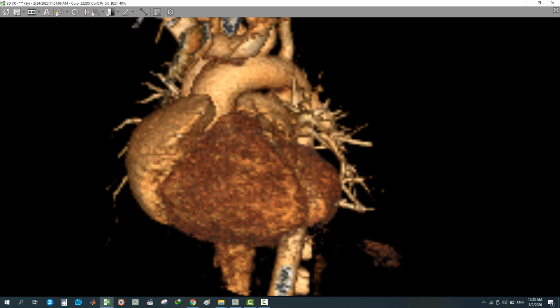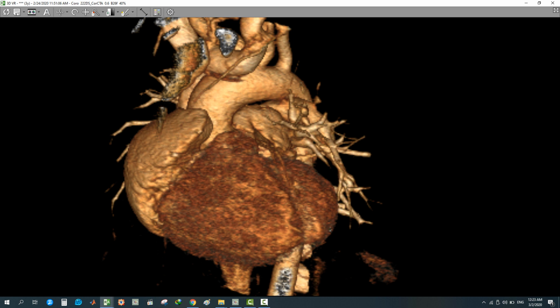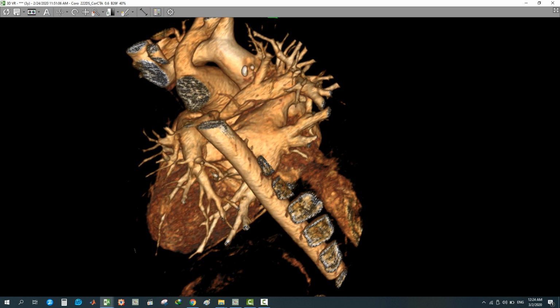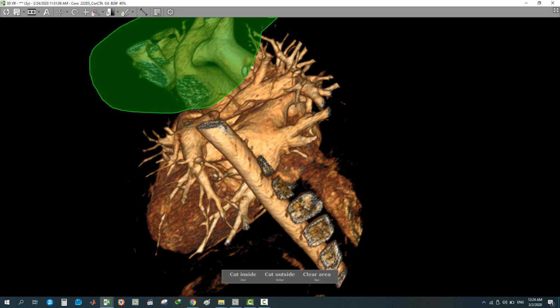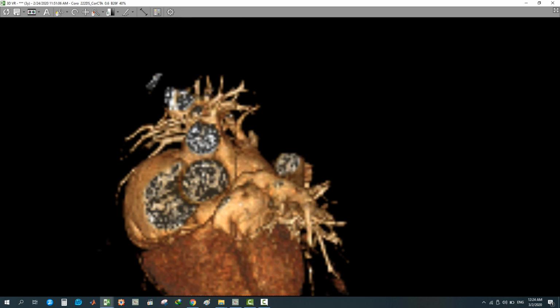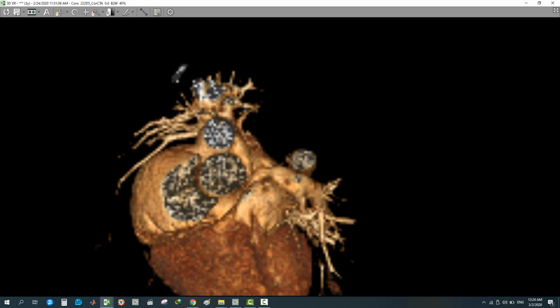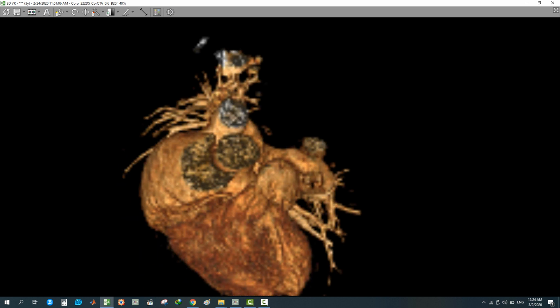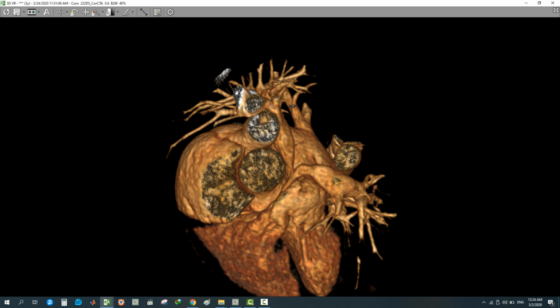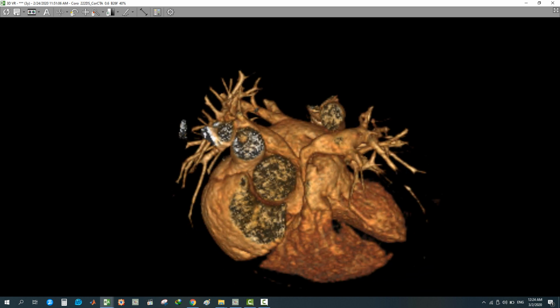Before I end, you can also remove this portion of the aorta in this way to get the pulmonaries, in this fashion, and this way. The pulmonary arteries are the most important structure to be assessed in Fallot, like this. This way, and remove these structures, and you will get the MPA, RPA, LPA, like this image.